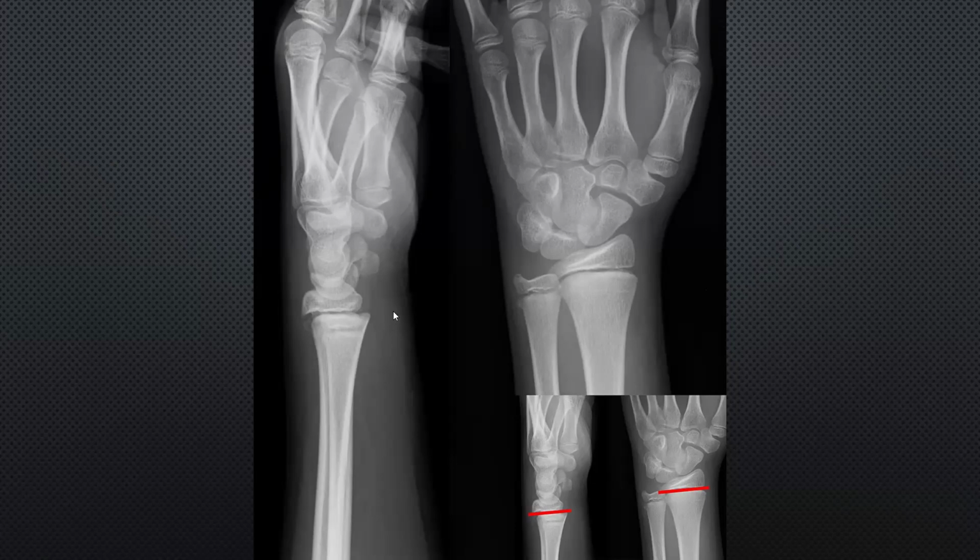Is this X-ray of the wrist, hand, or elbow? This is the lateral view of the wrist. If you find all the wrist clear, it means wrist. If the hand is not clear, it's not a hand. Easy. Do you find the elbow? No. So this is a wrist X-ray.